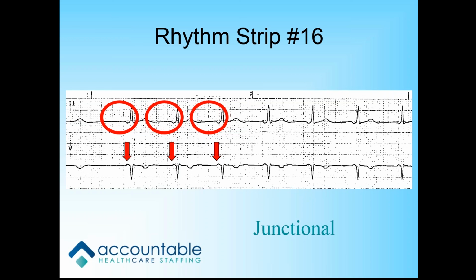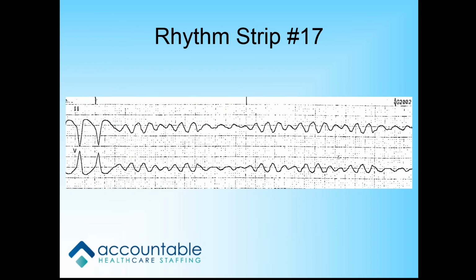Okay, Crystal, you're next. Oh, this is perfect, Crystal. So there's no rate, really. You have two at the beginning here that look like V-tach that has progressed into VFib. Exactly. You got it. So what are you going to do for this person? Defibrillate. CPR, defibrillate.